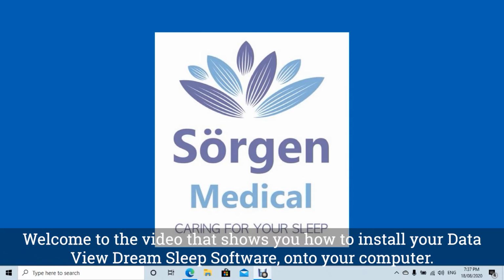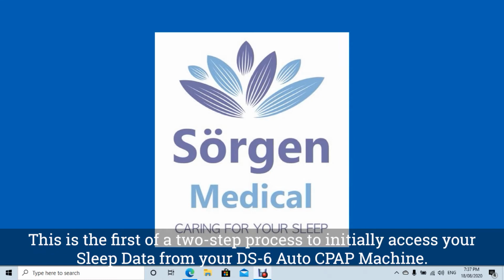Welcome to the video that shows you how to install your DataView Dream Sleep software onto your computer. This is the first of a two-step process to initially access your sleep data from your DS-6 Auto CPAP machine.